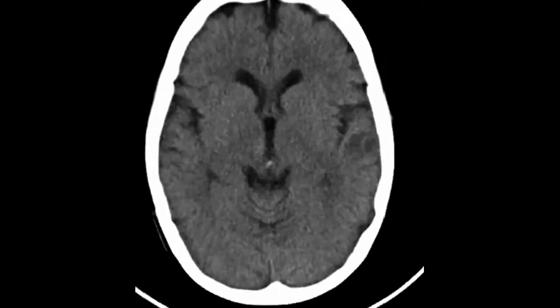Bismillahirrahmanirrahim. Today, inshallah, we continue some refreshing cases. I wish that you can enjoy with us some long cases. So this is some selected images from CT of this patient. What do you think about it?